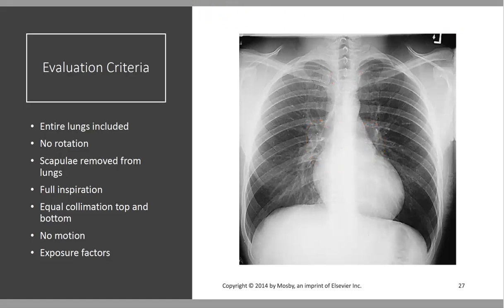And believe it or not, you may sometimes get so much rotation that, let's say on this side, the sternal end ends here, this clavicle, and over here it ends right here. That is not equal sides of the spine, right? So that means we have rotation.